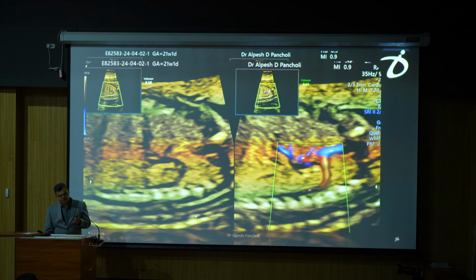So what should be the workup if you find any abnormal DV or umbilical vein connection? Look for the connecting site, whether it is wide or narrow. Then look for the markers of aneuploidies like trisomy 18, 13, 21, Turner syndrome, triploidy. Look for other syndromic markers like heterotaxy or Noonan syndrome. Do detailed fetal echo to rule out any other cardiac or venous anomalies. A thorough anomaly scan is needed to rule out any systemic involvement.